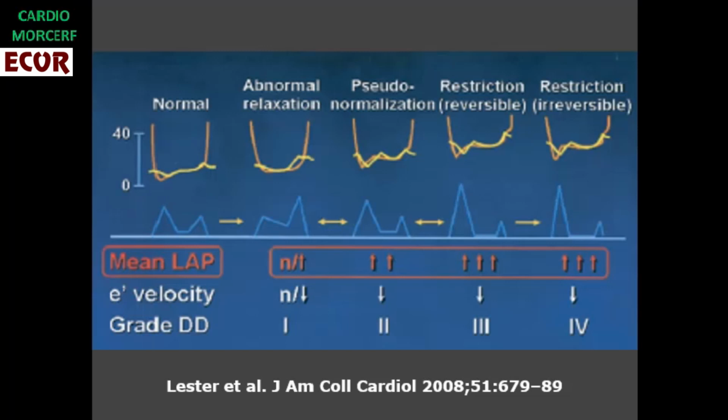What we're doing here is to use the tissue Doppler mainly to differentiate the normal mitral flow from the pseudonormal, since both have the same aspect, as we have seen already in a past lecture. The E' velocity, in case of pseudonormal, will be diminished and smaller than the A' wave. It will also be diminished in type 3 and 4 restrictive patients.